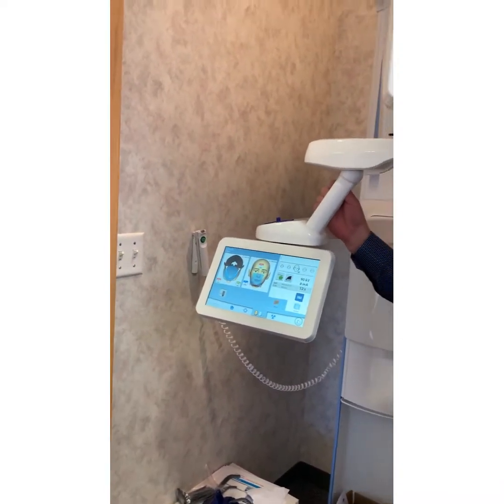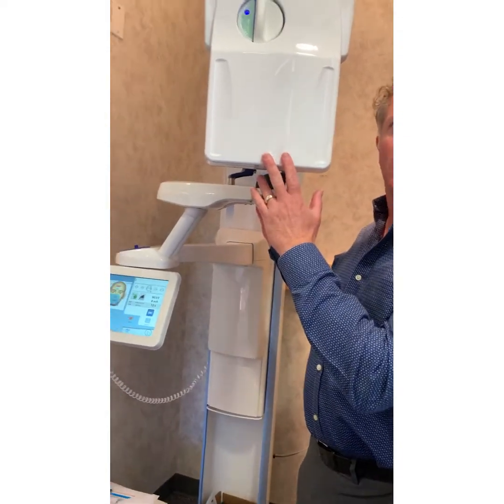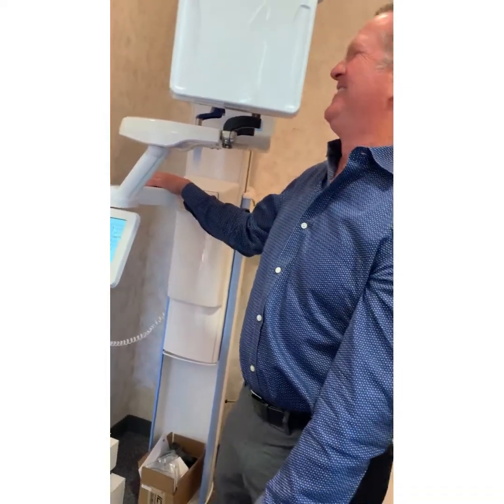Well, no. Did it sound good? It's on when it's on. There's a band and a chain up there that gives it tension. If you turn it off, then this is free floating. You move it. Okay, so you can move it. Does that sound good? Hey, we learned something. Don't move it when it's on.